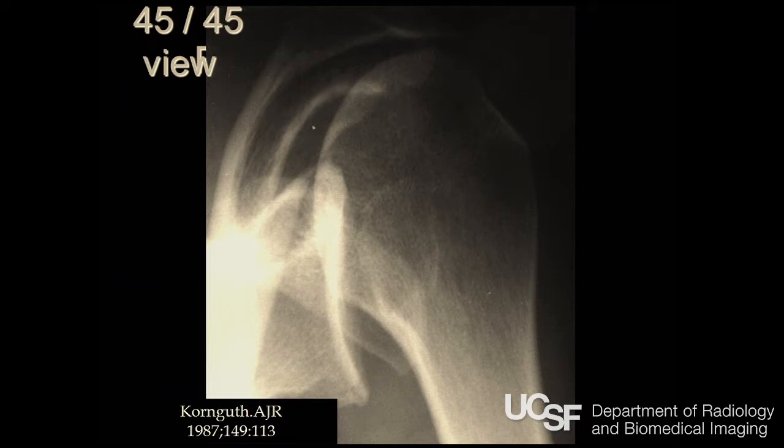They can keep their arm in the position that it's in, and you angle the beam down at a 45-degree angle with respect to the table, and you have the patient tilted 45 degrees. And that gives you some anterior-posterior information, and you'll never miss a posterior dislocation if you use this view. So this is a 45-45 view. This is anteroinferior, this is posterosuperior, and the humeral head is obviously dislocated posteriorly relative to the glenoid rim. The way I know it's anterior is here's a coracoid.